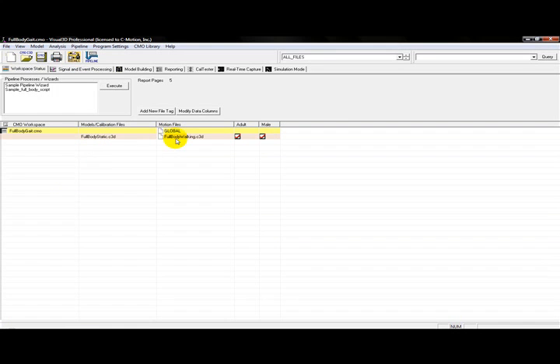This area indicates the files that are available in the workspace for processing and how they correlate to any models. Note that the model, called full body static, is lined up with the movement trial, full body walking, and the rows are the same color. This graphically shows us quickly that the movement data is associated to a model. It is necessary to associate motion data to a model in order for the data to make sense, and this way we will be able to see the bones.